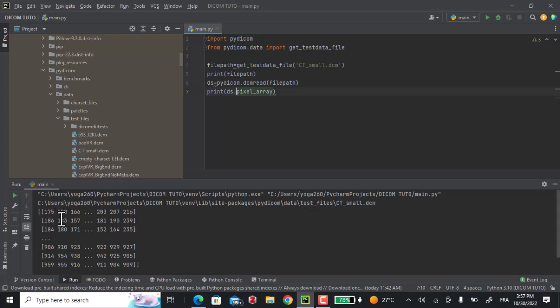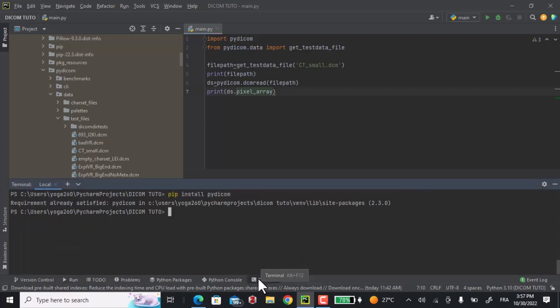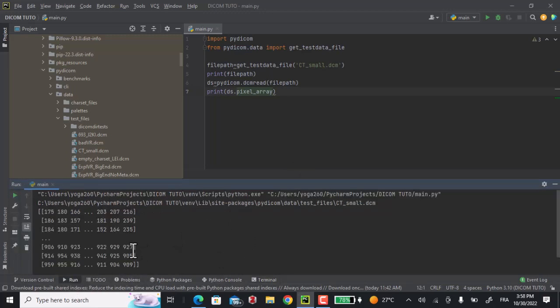And you may have a problem displaying this image if you haven't the NumPy library on your laptop. NumPy is actually a library that handles multidimensional arrays and matrices. In order to install it, you should just write pip install numpy. I have already installed it, so I don't need to do it again. So let's get back to our matrix here. That's the array of our image.